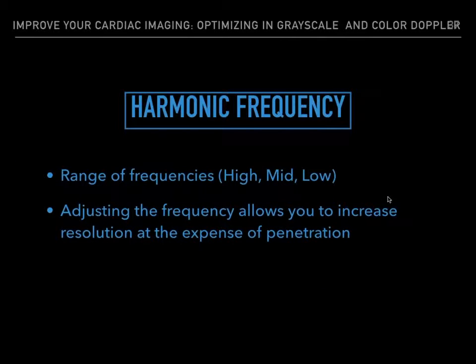Harmonic frequency has a range of frequencies, high, mid, and low, and adjusting the frequency allows you to increase resolution at the expense of penetration.